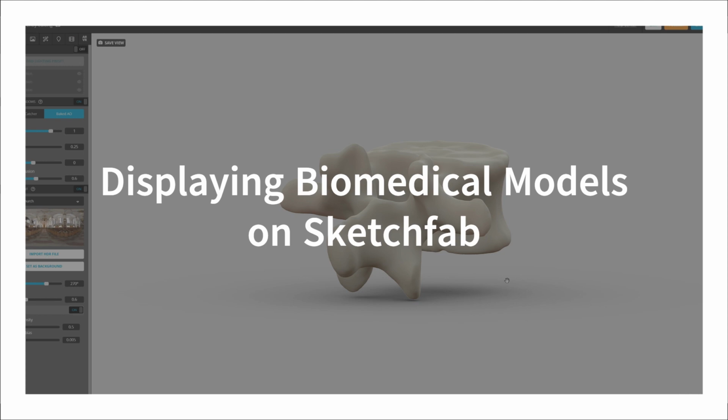So you've got to apply color if you want to visualize your models. You can make them pretty within your CT software, whatever software you're using to view your imaging data. But then once you get those models out and you want to display them somewhere like Sketchfab, then you need to add color. So I'm going to go through how to do that.